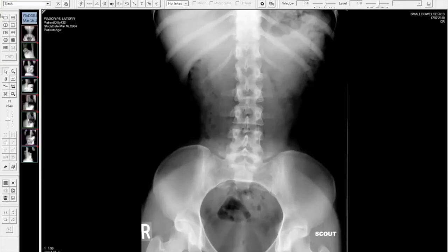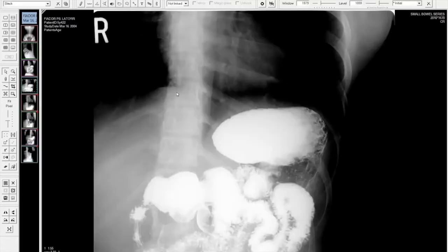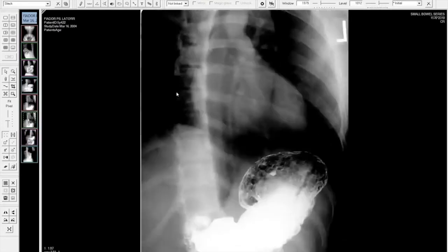And you can see in the top left corner the word stack. That's where, if a hanging protocol is applied, you will see. What that indicates is that I have a stack hanging protocol. For my CR studies, I simply want everything stacked so that as I scroll, I can scroll through the entire study and see one view at a time.